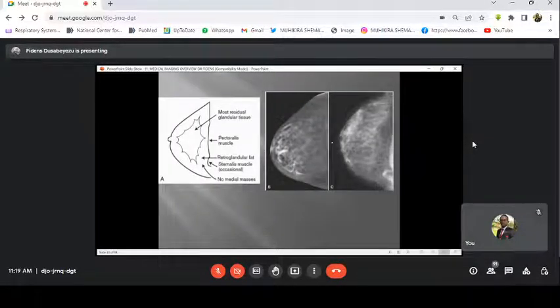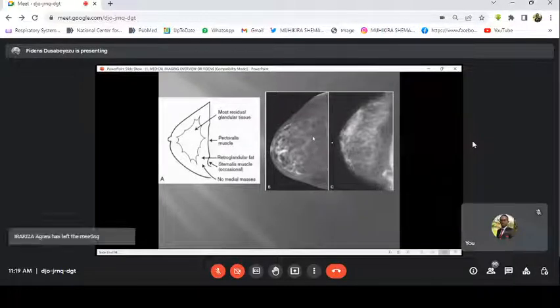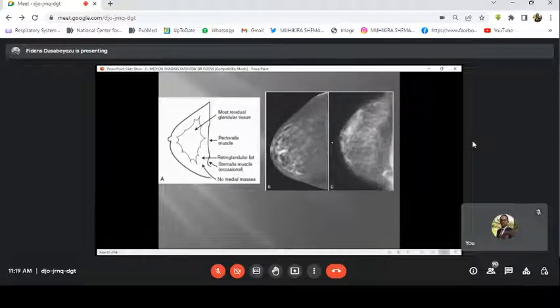So this is another image, to show you how the breast can show on the image differently. The whitish structures you see are fibroglandular tissue. The dark gray is fat. But on this other breast, you see the fibroglandular tissue is more in this image than this one, and the fat is less compared to this one.